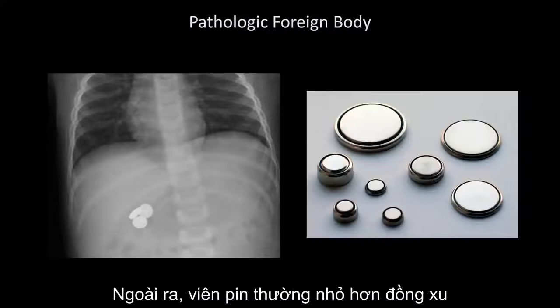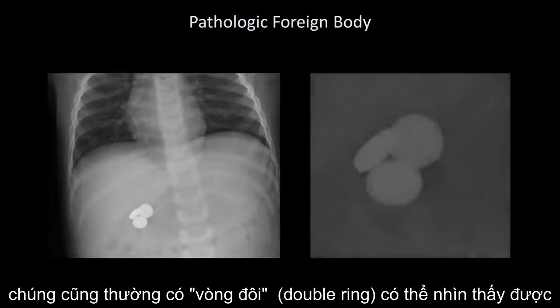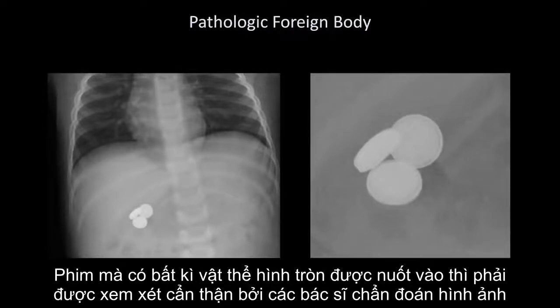In addition to button batteries generally being smaller than coins, they will also usually have a double ring visible, but the absence of such a visible ring does not rule out the possibility of it being a battery. Films of any flat, circular, ingested items should be carefully reviewed with a radiologist.